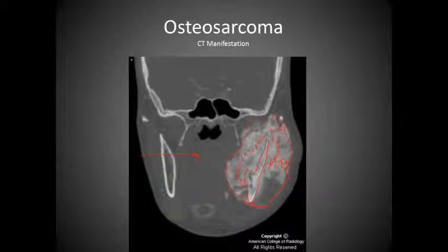And so if you'll notice the patient's soft tissue here in comparison with the left side, we see that we have a large bowing effect here, and that would be very noticeable just by looking at yourself in the mirror. And so fairly obvious that something is wrong here, and this is typical osteosarcoma.